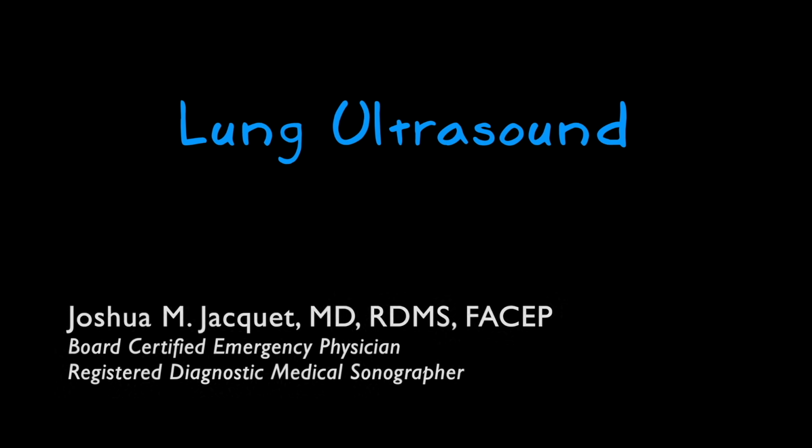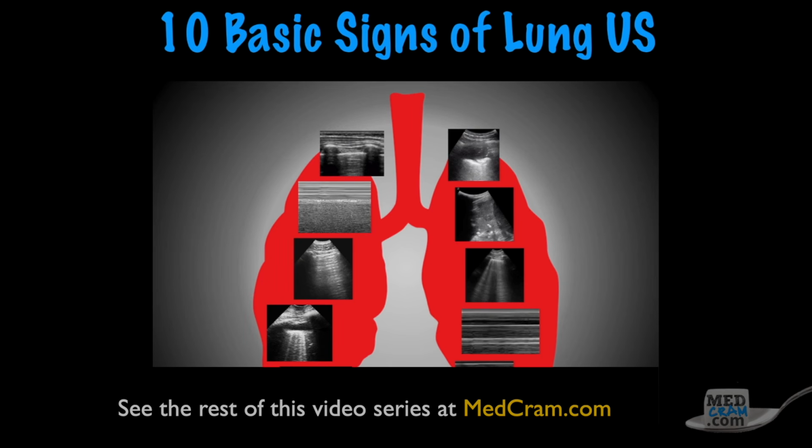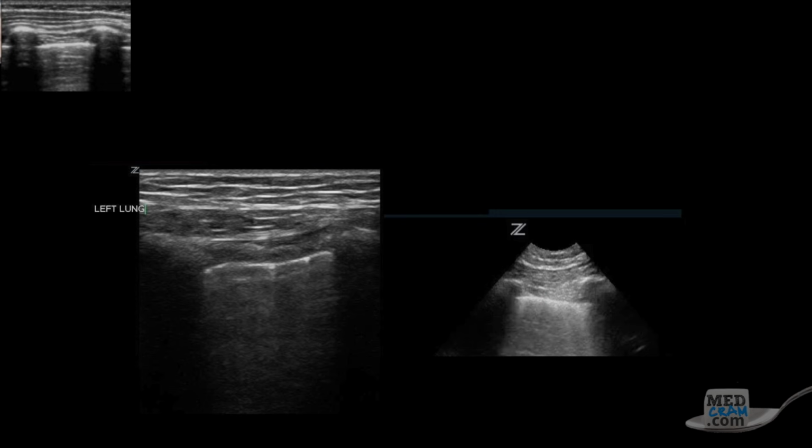In this video, we're going to introduce the 10 basic signs of lung ultrasound. Now, Lichtenstein breaks this down into 10 basic signs, and we will look at each of these signs in detail in subsequent videos. So the point of this video is just to introduce them and get you to start recognizing these 10 basic signs. So the first sign is called the bat sign.